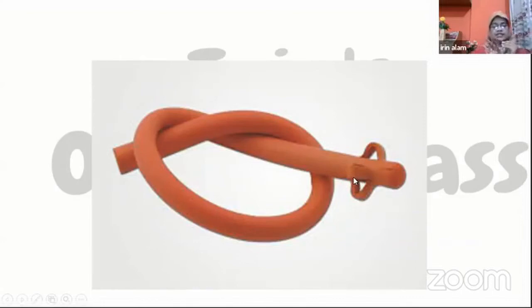In cesarean section, we do not always perform catheterization. That means we do not always use a self-retaining catheter. In case of elective cesarean section, we usually ask the patient to evacuate the bladder herself by going to the washroom. And in some cases, we have to evacuate with this catheter.